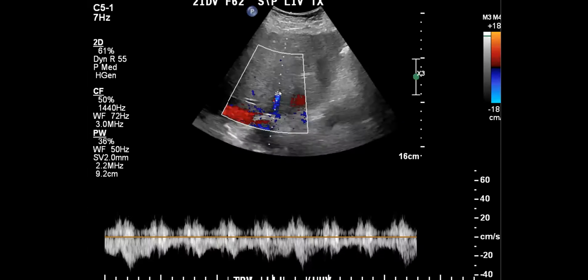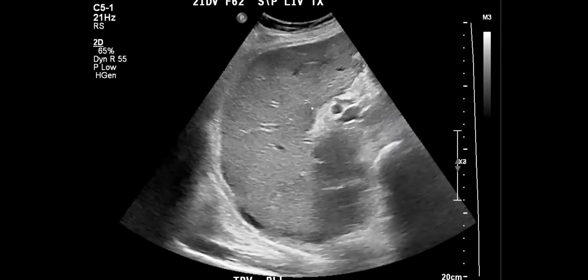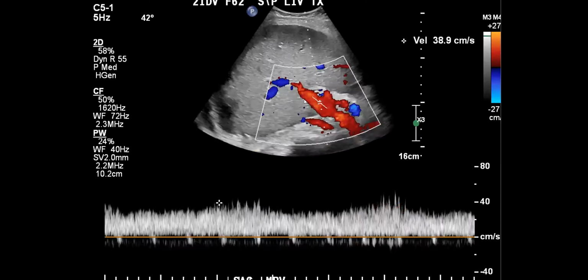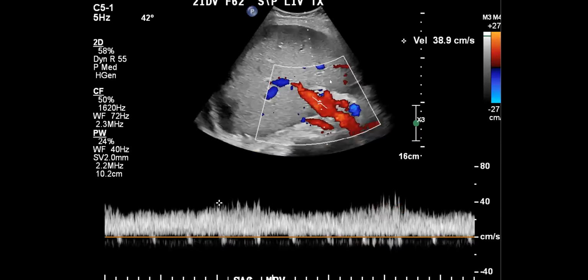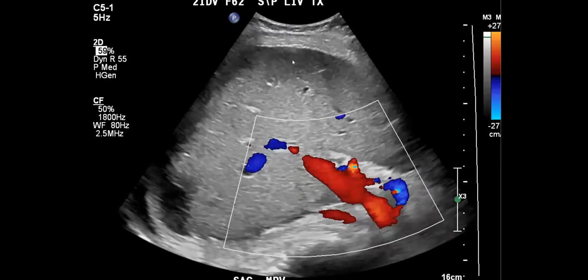Okay, so you can see that this was a liver, and it wasn't called prospectively, but you actually can see that the areas of infarction have different echogenicity, and they really correspond to what we see on CT. But they weren't called. I mean, I wouldn't have called them either, because you kind of think that it's just related to heterogeneity, beam attenuation, but these were all actual infarcts that we see on sono.